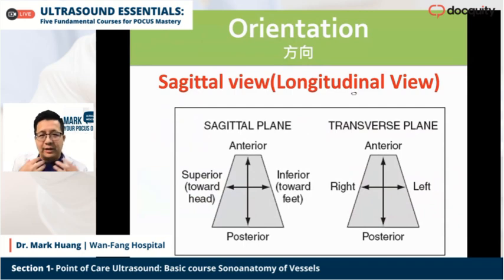At first, let's introduce the orientation, because we need to talk the same language with the sonographer. When you post an ultrasound picture, you should align the pictures as if you are performing the exam in the room. So at first, we have to know the same orientation.